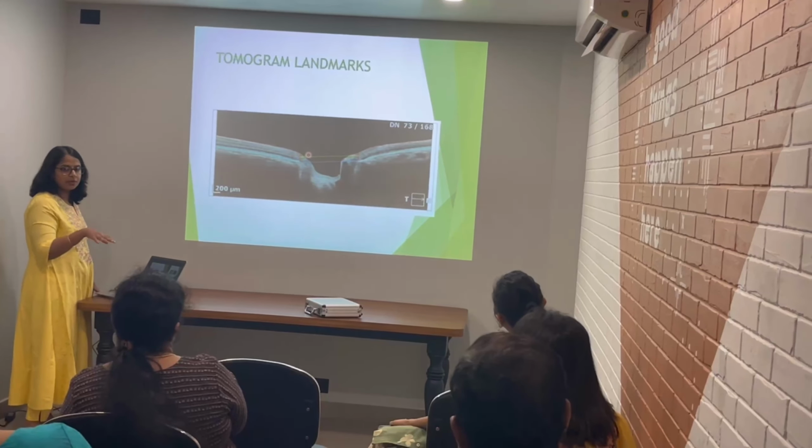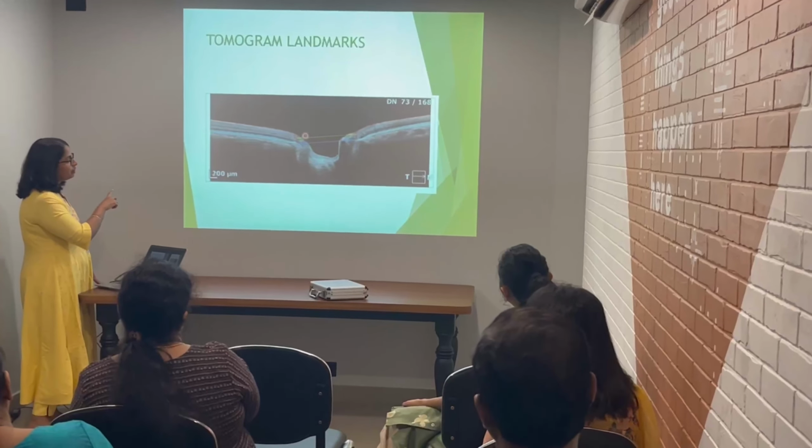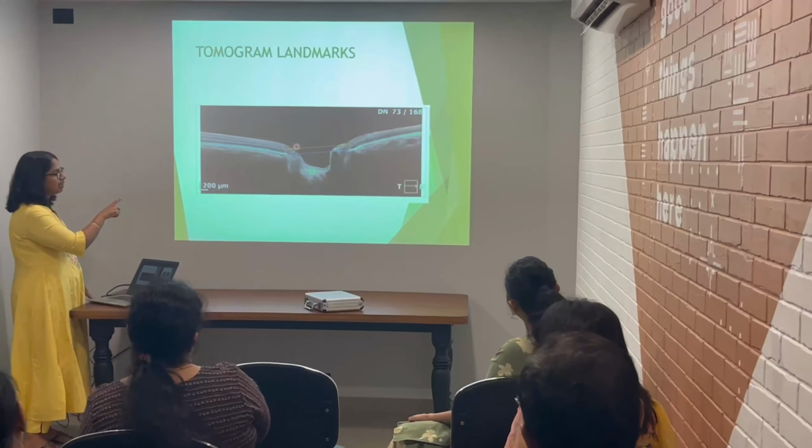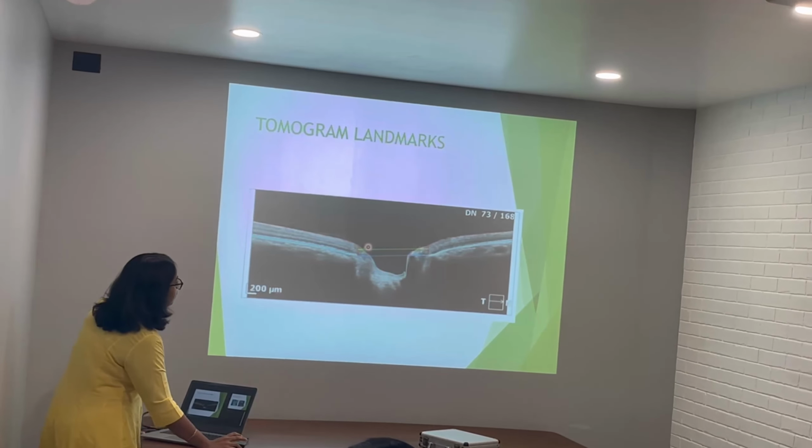That's the concept of the OCT imaging. So we have to check this scan picture to see whether these lines are correctly aligned. If there are any vitreous floaters or any hemorrhage, these can be irregular. So we have to check to know the quality of the scan.